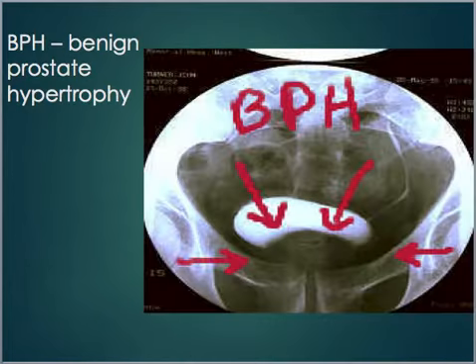This is what we call BPH, a benign prostate hypertrophy. So what happens is if the prostate becomes enlarged, then it can put pressure on the bladder, which causes pain. It can also cause difficulty urinating. So if a man has difficulty urinating, that's one of the first things they want to check, to see if the prostate's enlarged, which is causing pressure on that bladder. So normally the bladder would be more of a round oval shape here, but it's causing it to push up.